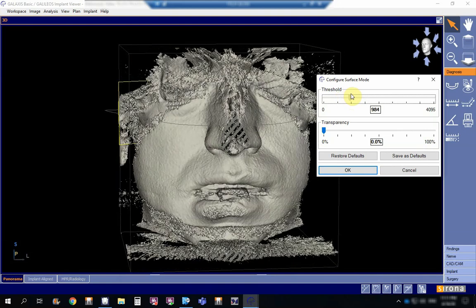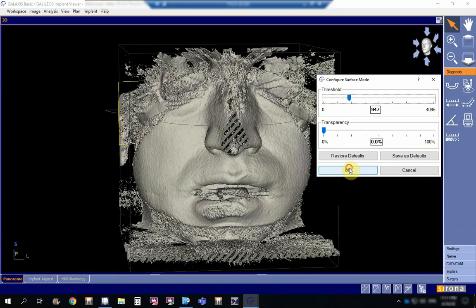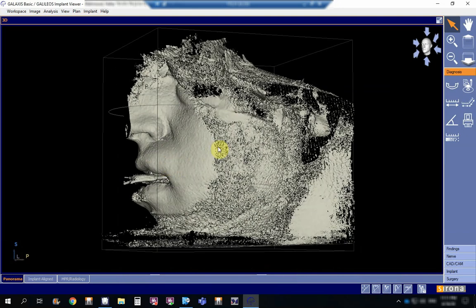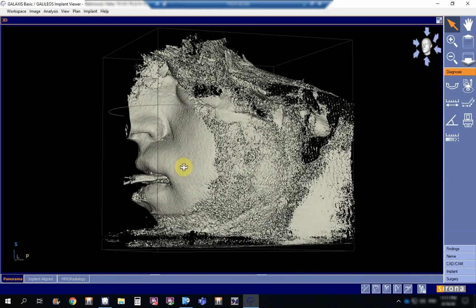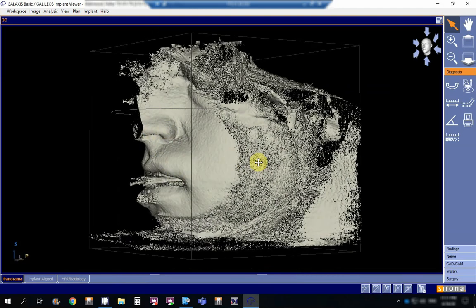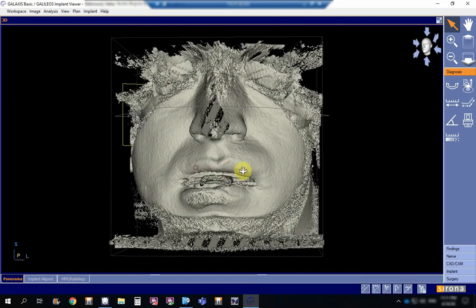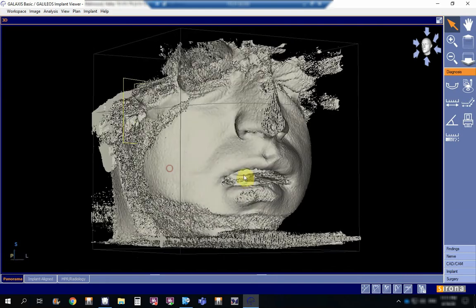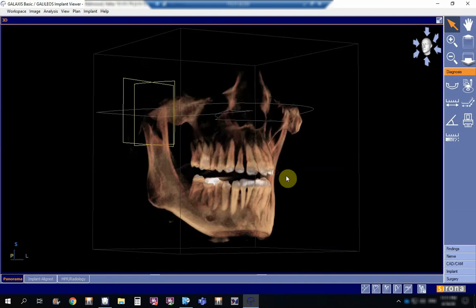Actually, this is not a real soft tissue. Why? Because it's a soft tissue, yes, but unlike the CT, the CAT scanners, you cannot differentiate between muscle and the cartilage, for instance. It's a whole lot of tissues according to the signals which are collected from the patient.